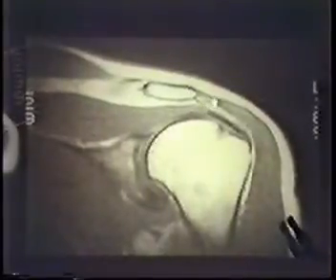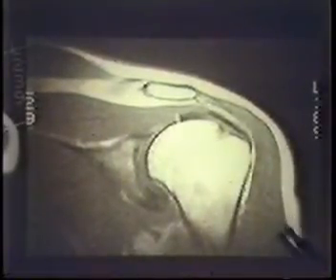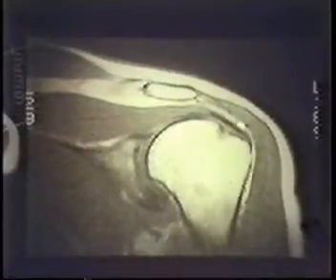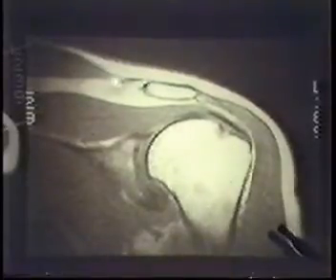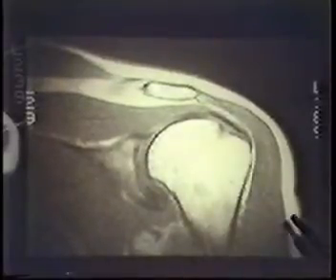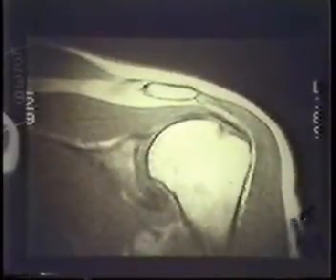Now, as far as imaging the shoulder, I think it's really mandatory to image an oblique coronal plane which is along the axis of the supraspinatus muscle, as you can see here. And the image of the supraspinatus muscle looks like this. This is the muscle body. This is the musculotendinous junction, a very important landmark. It should be at the 12 o'clock position. This is the tendon itself and should be nice and black with a uniform thickness. This is normal. Also notice that there is a fat plane underneath the acromion here, which is intact in this patient.